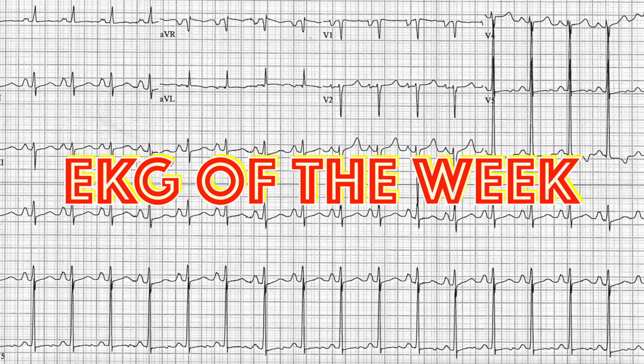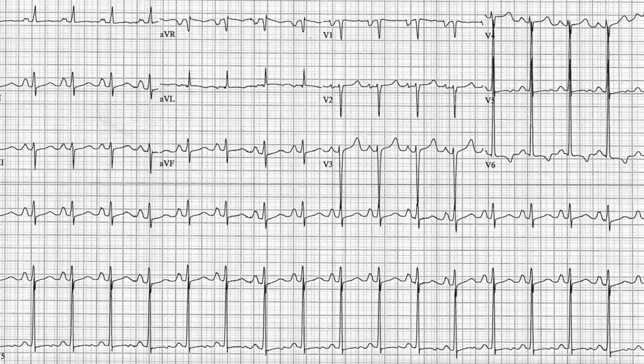EKG of the week. Let's look at another EKG and try to pick out the salient points of it. Again, just as an FYI, I started to do this as a teaching aid for our paramedic class, and this is folks that just started to learn how to read an EKG. So some of the early ones are based on that. This one is a common morphology that you'll see, but that we haven't really talked about so far.